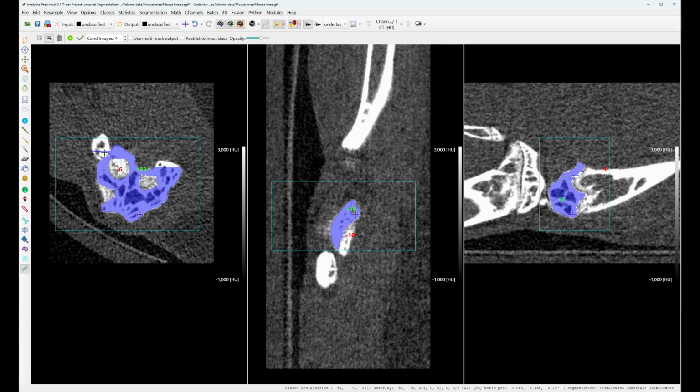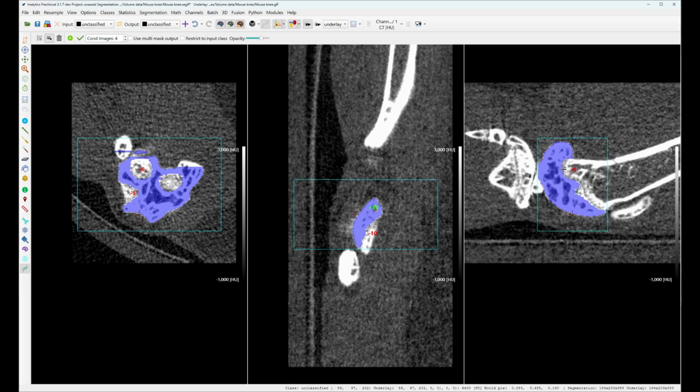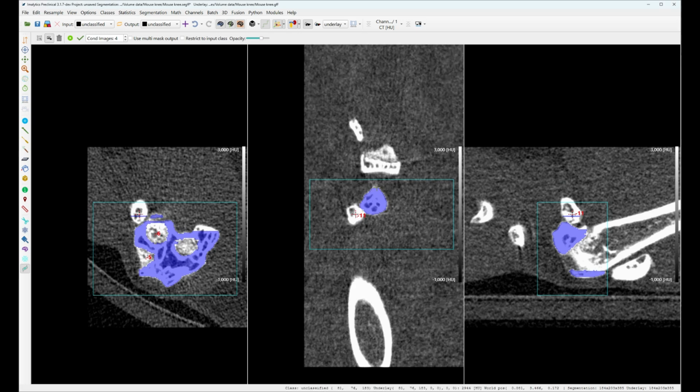Once complete, you'll see the mask fill in across every slice in the propagation plane. Scroll through the other views and you'll see the 3D extent of the segmentation. If you are unsatisfied with the final segmentation, you can add prompts to a few of the slices that have been segmented poorly to correct the inferencing. Then, you can run the propagation again, and SAM2 takes into account your newly added prompts.